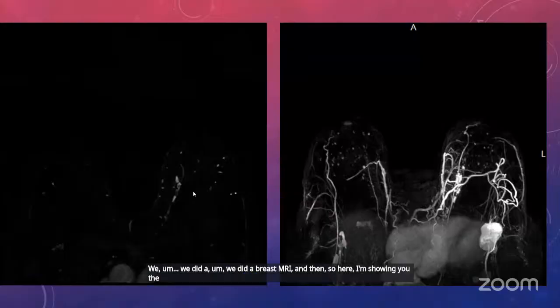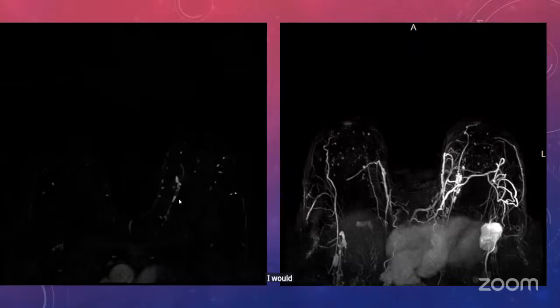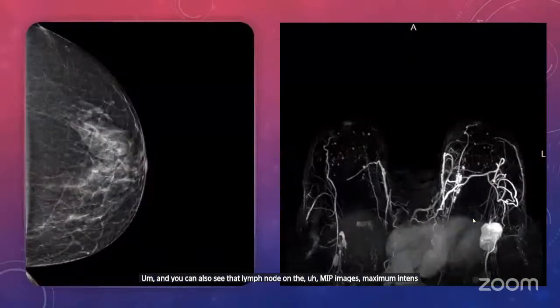So knowing that she has a breast malignancy, we did a breast MRI. Here I'm showing you the post-contrast subtraction images for this patient, and here's the MIP of both breasts. What easily stands out is this linear clumped non-mass enhancement in the inner left breast. You can also see that lymph node on the MIP images, maximum intensity projection.